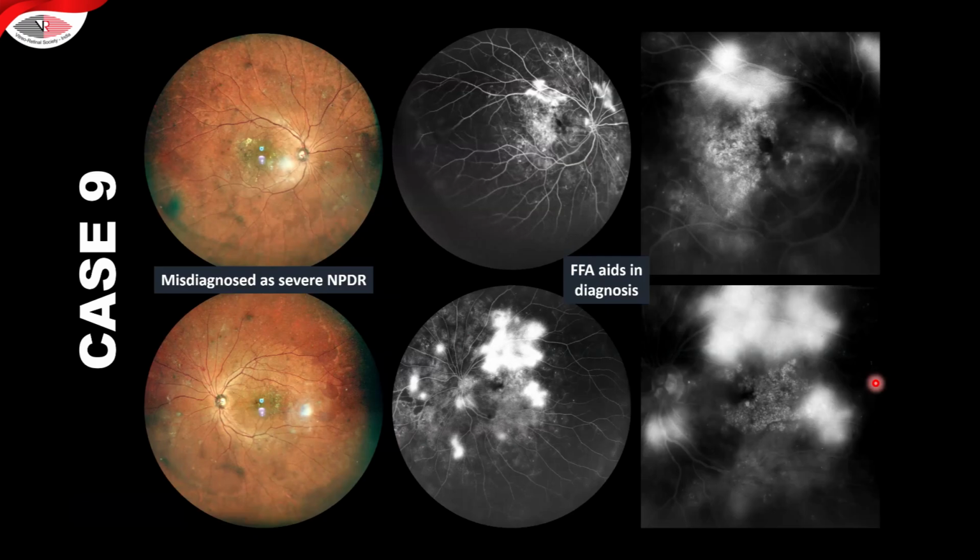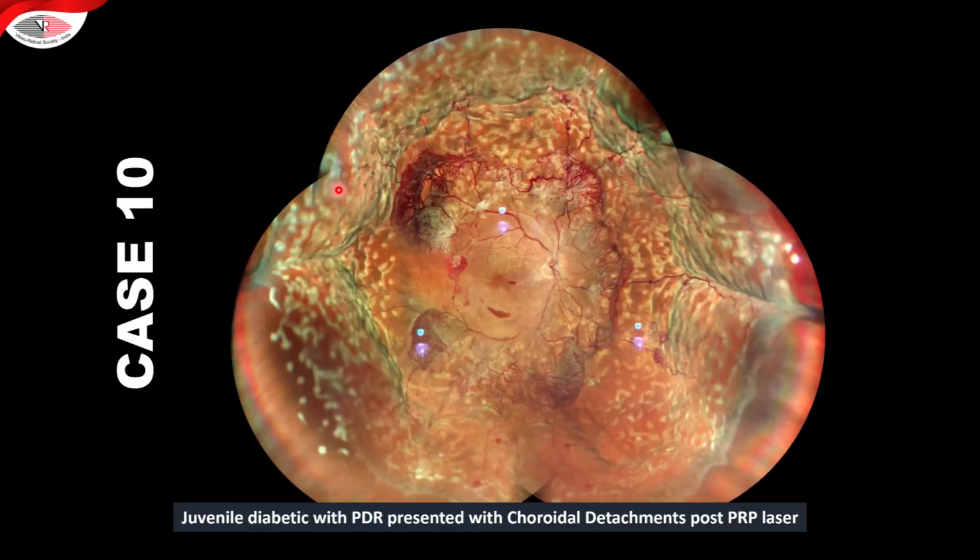Some of them have featureless retinas. If you look clinically, you may think that there are some hemorrhages, but it does not look too bad. But when you do the angiography, you'll see a totally different picture. And so these are the cases where you have to be extremely cautious. Featureless retinas, this is what will reveal much more in angiography.